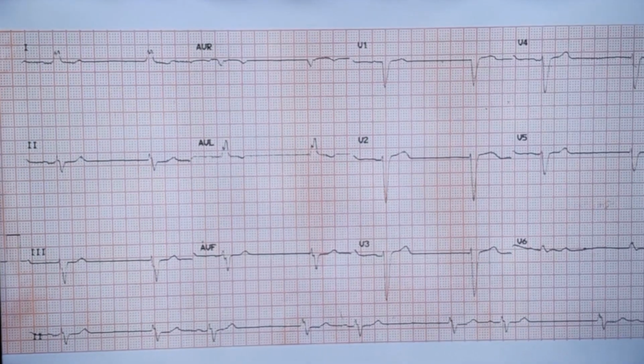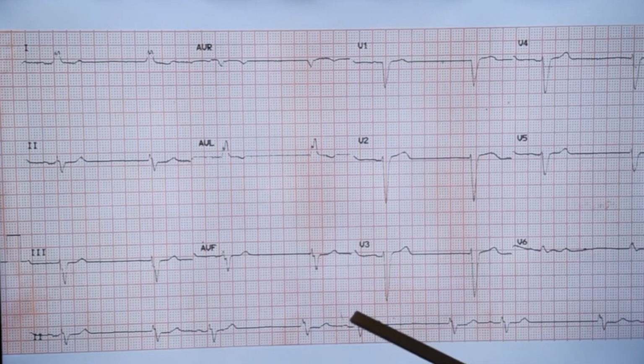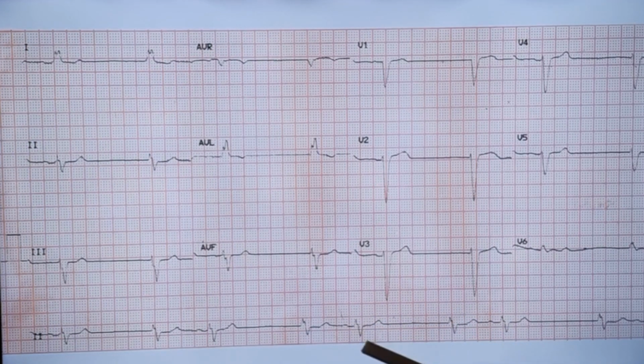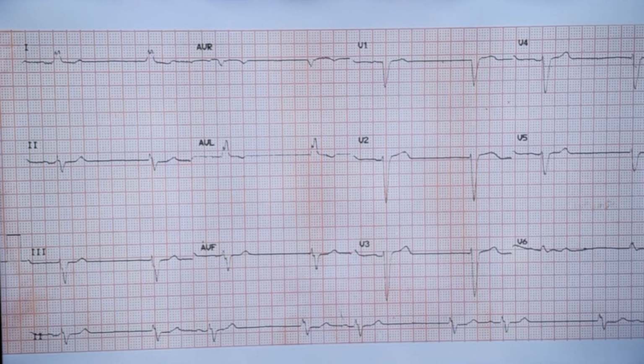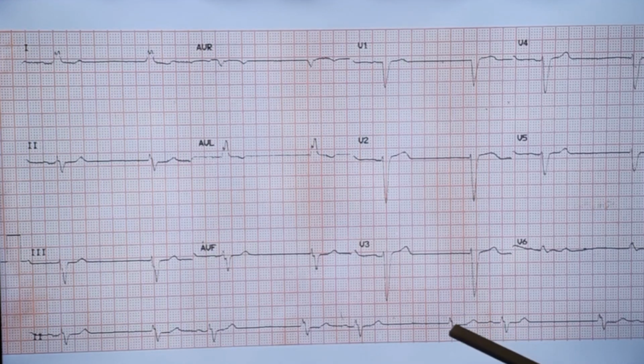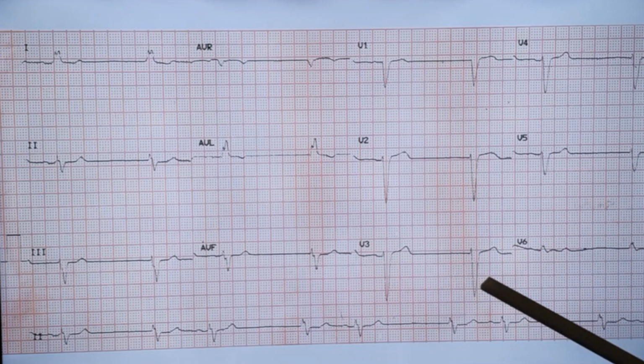But this is much lower than that. So it could be a ventricular escape. If it is a junctional escape, you can definitely say that the junctional node is also diseased. Otherwise, such a delay in escape would not occur. Why we think of junctional escape, we have discussed earlier, because of the bundle branch block pattern.